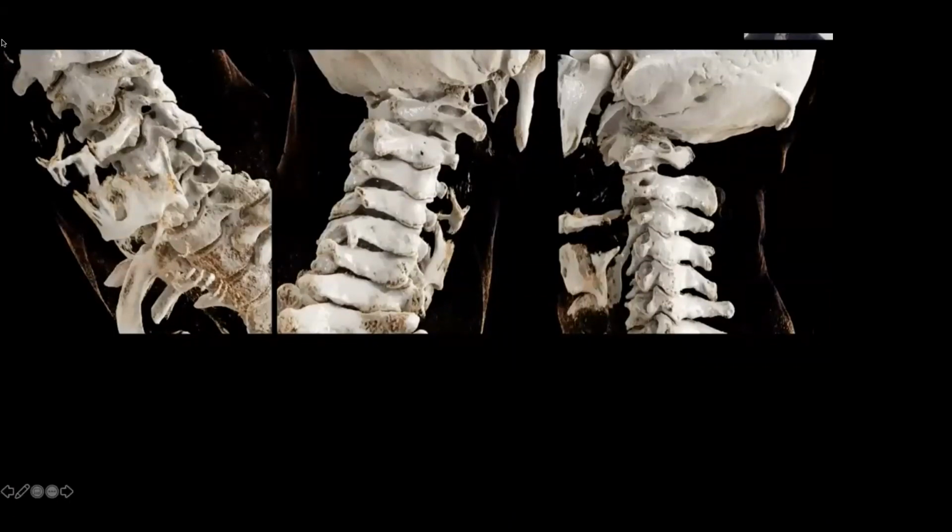In this case, you can see, and this is an important anatomic detail, that the C2, C3 facet joint is actually orientated more medially than the remainder of the facet joints. And again, biomechanically, we talk about C2, C3 as being the root of the cervical spine, because of its ability to maintain that position and maintain that lock between the atlantoaxial joints above and the column of the spine below, and not being able to tilt out laterally is part of that.